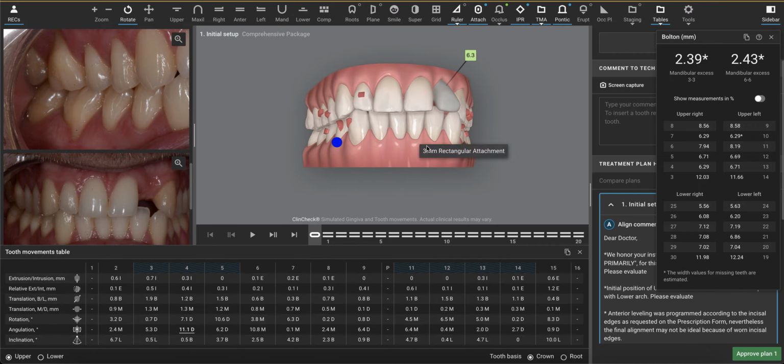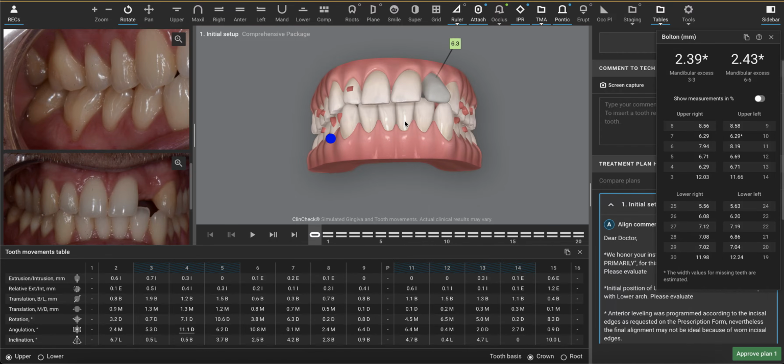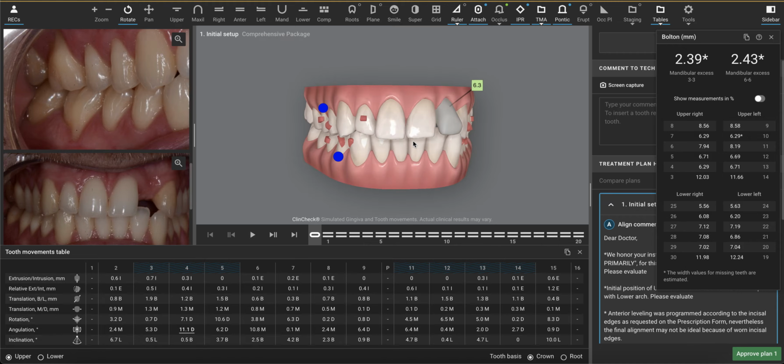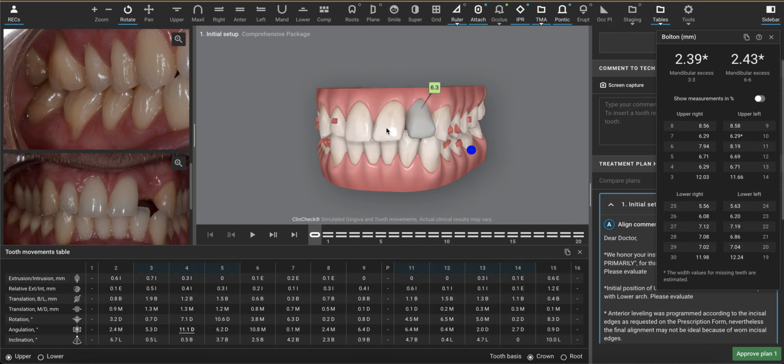So looking at this situation, it looks like the 1, 2, 3, 4. Sometimes when it's a pretty significant mandibular excess, there's an extra premolar. I say sometimes. I've seen it happen. I would say the bulk of the Bolton discrepancy comes from these narrow incisors. So it's good to know what the problem is, because the solution should always aim to address that initial problem. So if we're going to do IPR on the lower, I think we're missing the boat.